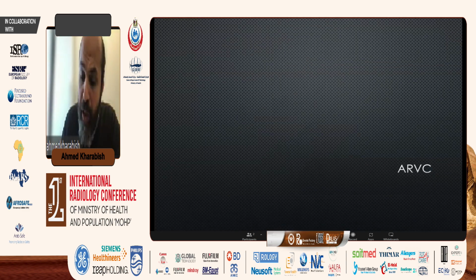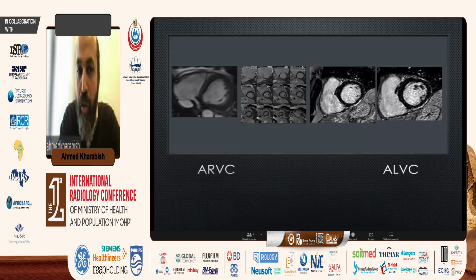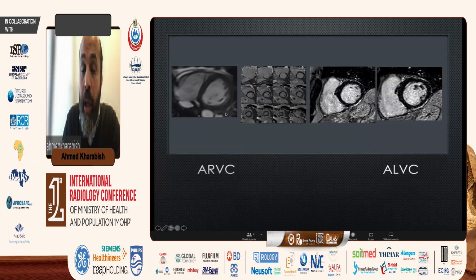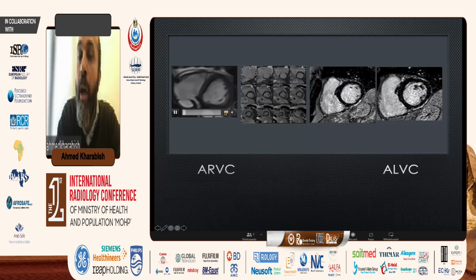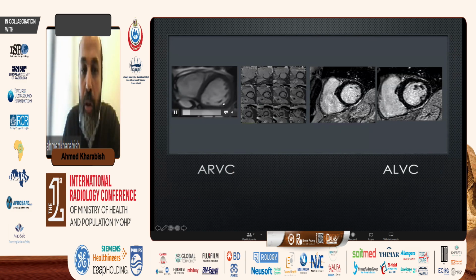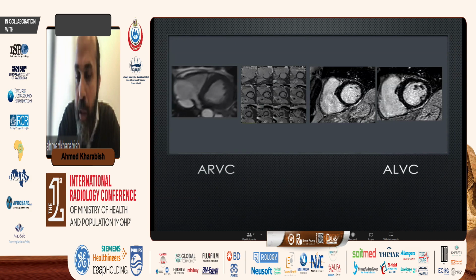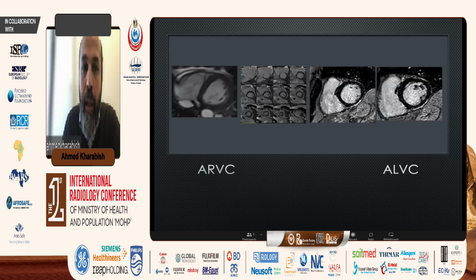ARVC is a very important differential diagnosis, and sometimes it's difficult to differentiate between the athlete heart syndrome and ARVC or ALVC. In athlete heart, it's accepted to see mild to moderate dilatation of the right and left ventricles, but it's not accepted to see any dyskinesia, which is the major criterion of diagnosis of ARVC, as you can see on this video on the screen. So there is dyskinesia of the right ventricular free wall here.